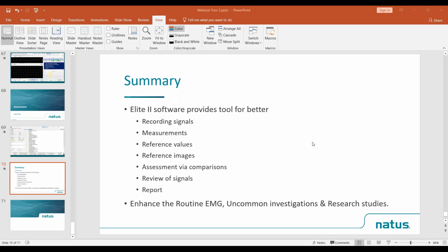If it is, let's say, 25, and you see by visual assessment there are 3 or 4 motor units, that's going to be your normal recruitment. Or if you see a cumulative firing rate of about 27 or 28, but you see only 2 motor units, that's going to be reduced recruitment.